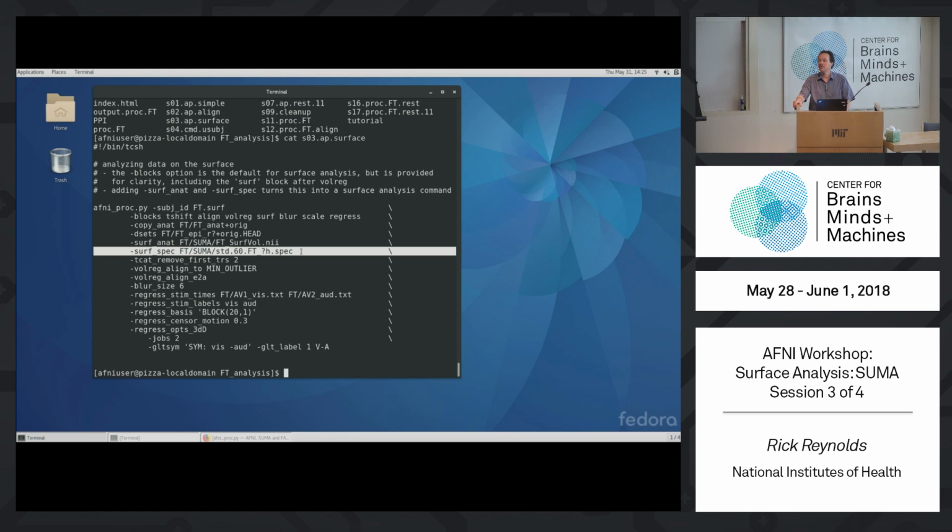We haven't made that. Mm-hmm. What are the files copied over from FreeSurfer? That make spec fs, when you run that, it will copy many files. And we'll take a brief look at what files we have here. We have a subset of the whole set, but it gets the parcellations, the surfaces, a bunch of things. And if you want something else, you can let us know and we can add it.